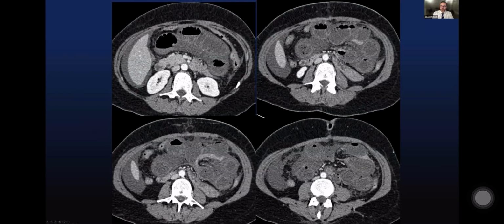This is another patient with an internal hernia, swirled small bowel mesentery, clearly hypoenhancing small bowel with extensive mesenteric edema. This patient had nearly half of her small bowel necrotic at surgery. And so these are patients that we try to catch earlier when they present at a proximal time in their disease course.